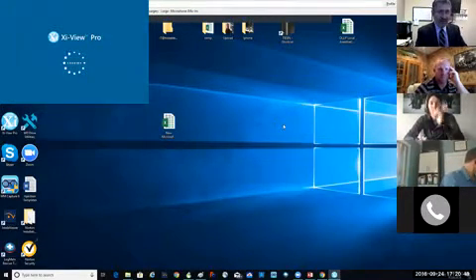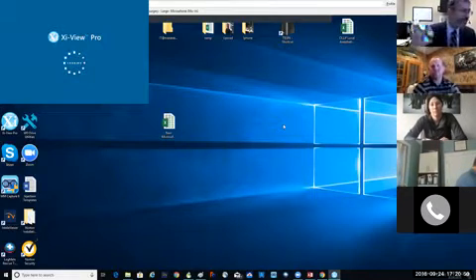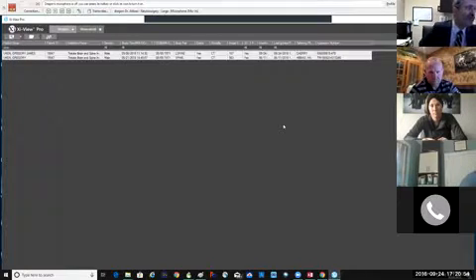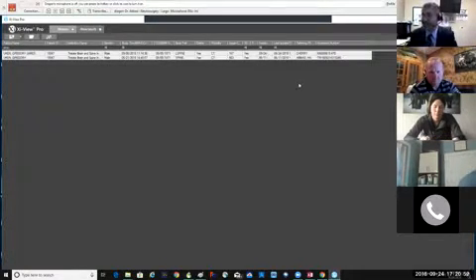Then, right now I'm putting a CD in my CD drive, so you have to do it on a computer that has a CD drive.